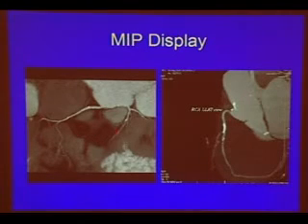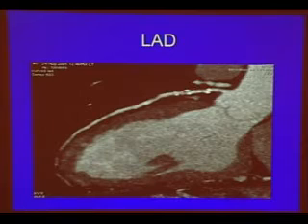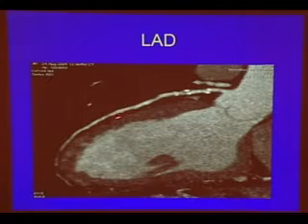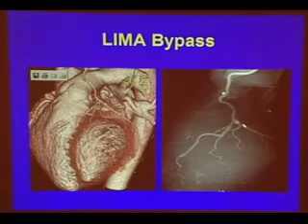And this is where we want to catch the patient. We want to be able to catch the patient at an early stage where we can prevent any kind of severe outcome. Again, this is just showing you the left anterior descending coronary artery, again showing you already some mixed plaque, calcified and fatty. And typically when we see this, we'll describe the lumen or the stenosis and the location of these plaques. And typically it's enough for the patient to actually take action.